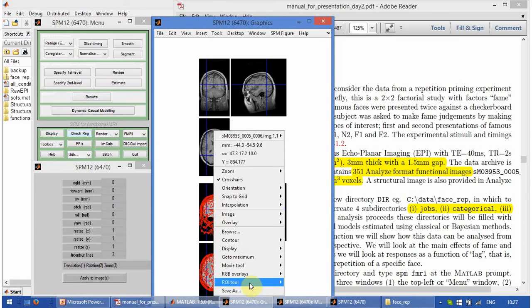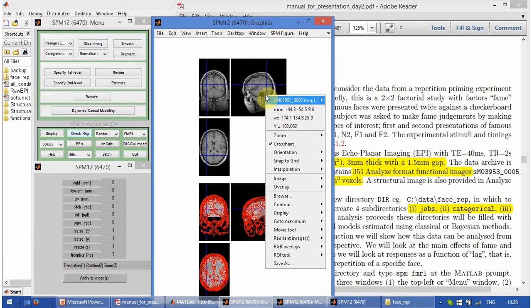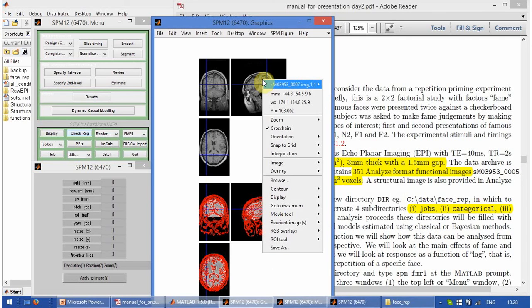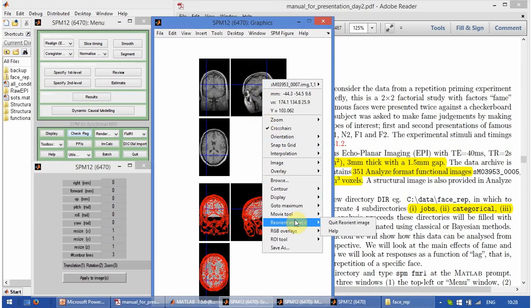Okay, now we can view to orient. Sorry, you have to click on the image that you project, so that you stop this.